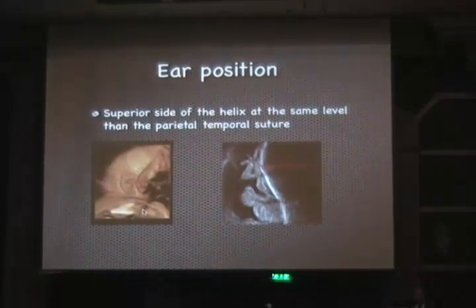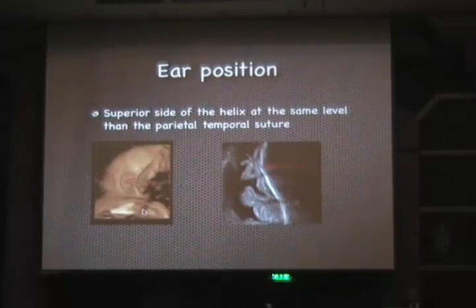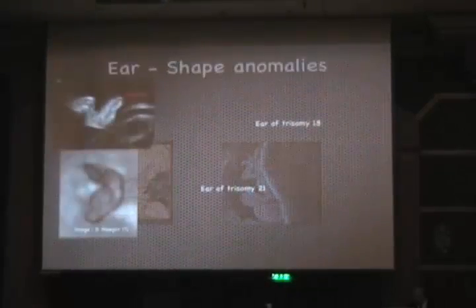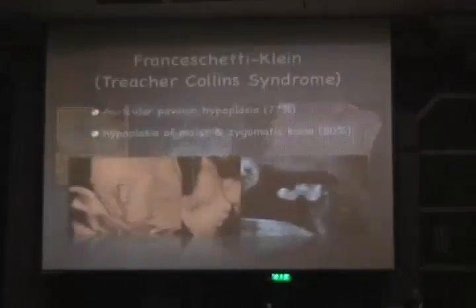You understand? You have the volume, you show the surfacing. In the surfacing, you see the ear. You pass to the bone X-ray in 3D. You see the suture. You say that the suture is here. If the ear is lower, we can say that it is a low set ear. Okay? We'll continue.